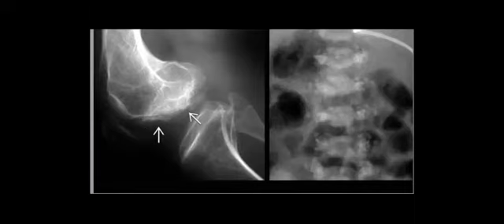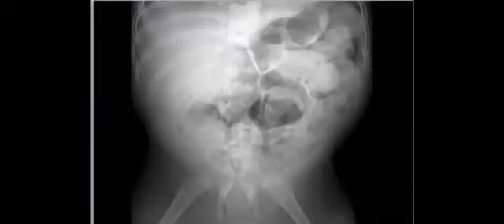Okay, let's shift to another case, an important pediatric case. Sacral agenesis. Okay, so you start with the sacral agenesis, perfect. And what is your thinking now after you mentioned the sacrum? Caudal regression syndrome. Caudal regression syndrome? Yeah, perfect.